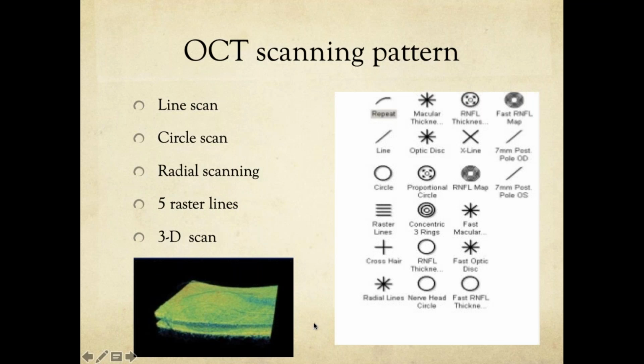If the overall macular volume is more than 8.0, 7.7 to 8 is normal, let's say it's 9.6 or 9.7, but the central macular thickness you get is 245, the rest of the macula is still edematous. The inflammation is still going on. And if you stop Avastin or your treatment at that stage, the patient will come back to you in 1 week with the central macular thickness now thicker, because the inflammation from the rest of the macula has spread towards the fovea and ultimately caused, again, a decrease in the vision.